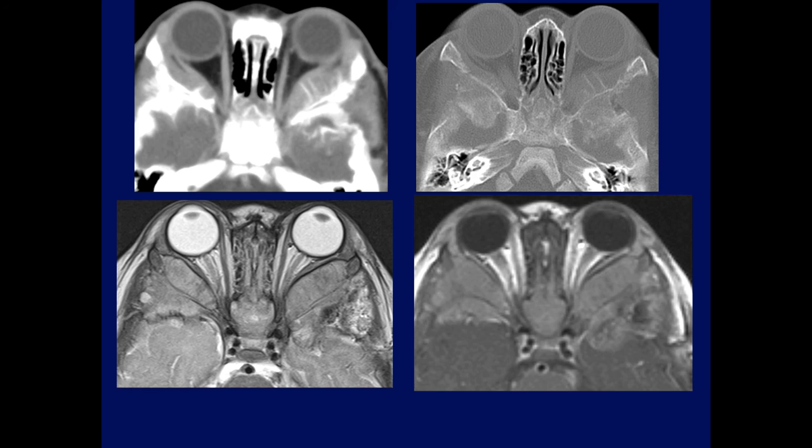Here's another case. Same diagnosis, neuroblastoma. Look what has happened here. Tremendous expansion and soft tissue tumor along the greater wing of the sphenoid, encroaching on the orbit here, and you see the mass in the middle fossa. Look at the expansion of the greater wing of the sphenoid. Both cases of very young children were unfortunately neuroblastoma.